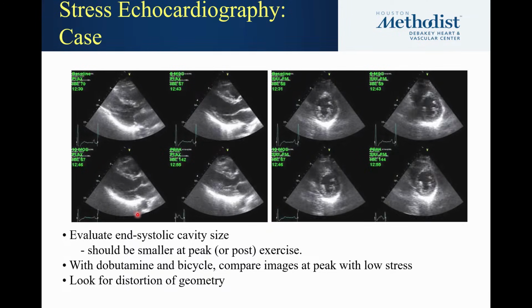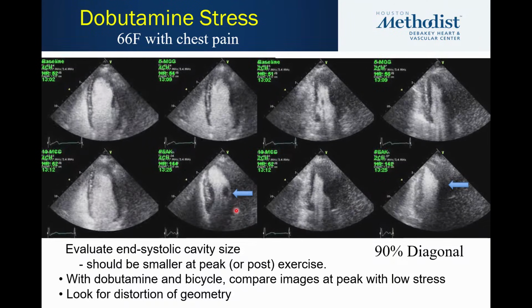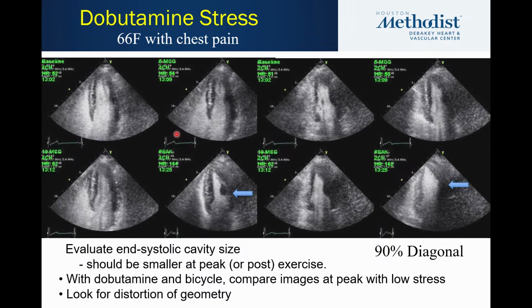But notice how small that cavity is. Now, this is one that also has a little bit of circumflex abnormality. So the same story, the cavity gets smaller, this is just a little area. Let me see if I can do the same trick of maximizing it.